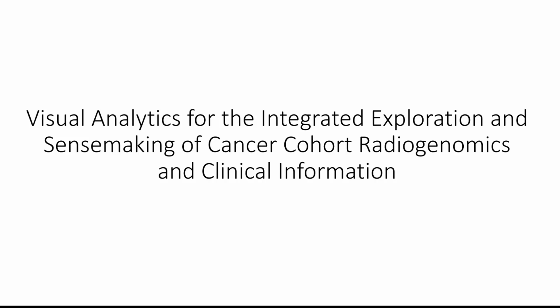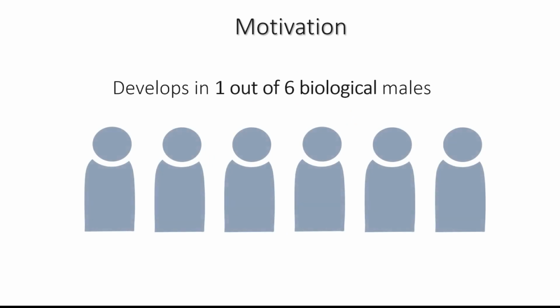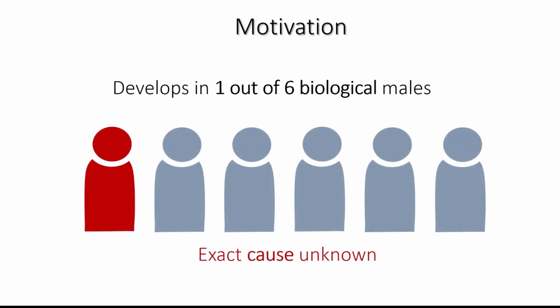We present the visual analytics dashboard for the integrated exploration and sense-making of cancer cohort radiogenomic and clinical information. Our motivation is prostate cancer, a very common disease in the biological male population. It's developed in 1 out of 6 persons, and still its exact cause is not known.